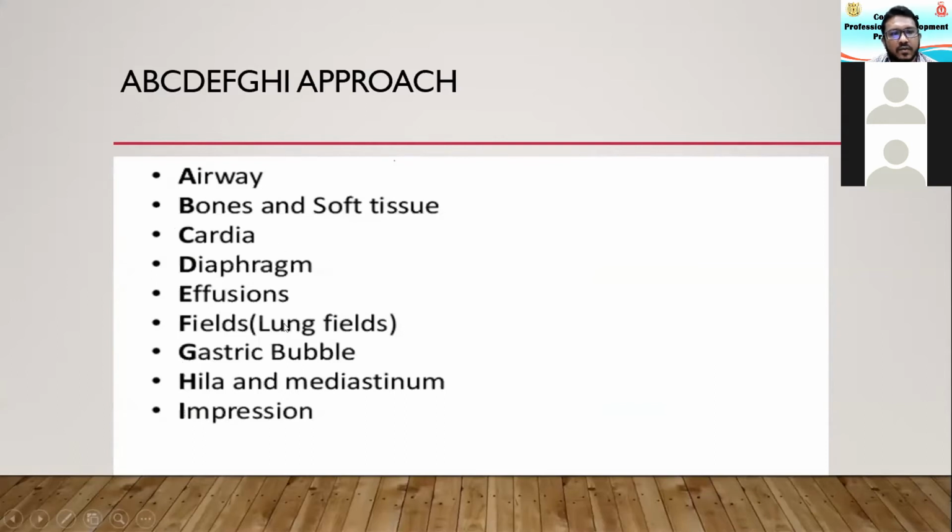So whatever makes it easy for you, you can do it, but you have to go in an order. Don't jump into different fields in between, or you will come to a standstill and it will be very hard for you to diagnose. So always make your own way of diagnosing and interpreting a chest X-ray, but always follow the same methodology in every chest X-ray.